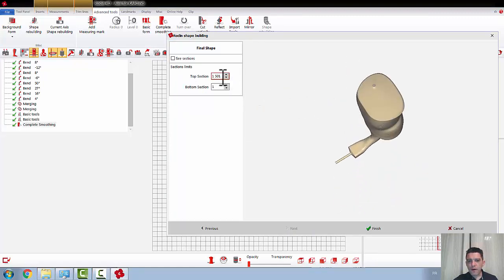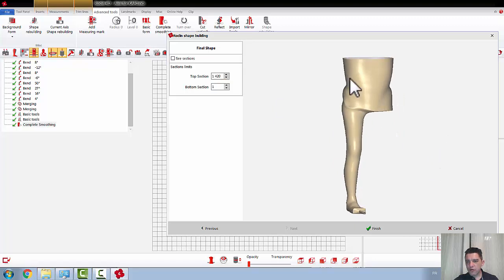Now I want to open the top part. Probably with the control I can go faster. If you decide to cut more, of course, if I am moving the scroll of my mouse, but if you click on control, you can move faster. Okay, so you decide if you want to leave it like this or what.